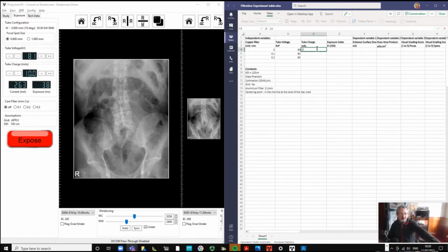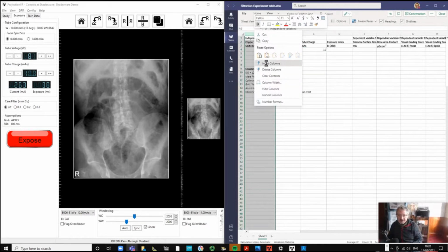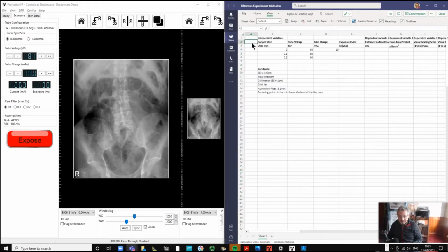So that's our first exposure, yeah? It's taken us a few exposures to get set up, if you like, but the first exposure that worked was exposure 6. So it was our sixth attempt. But now we're all set up.